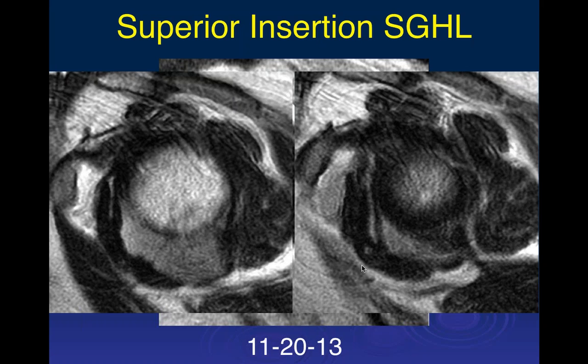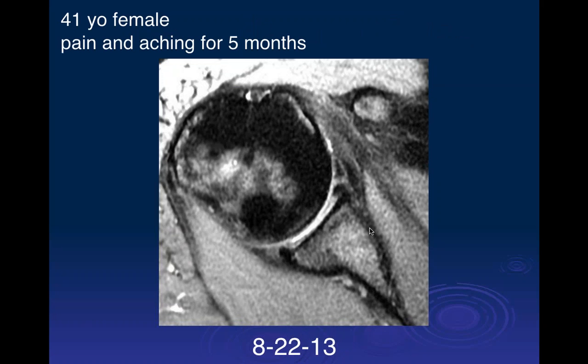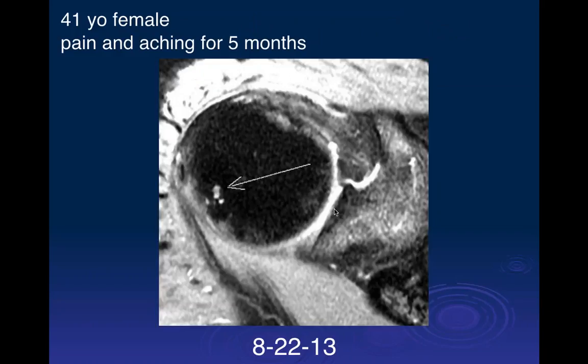If we go back to the axial images on this case, is the anterior labrum absent anteriorly and superiorly? Like if you keep going higher? Or is that too high? Okay. We skipped a bunch of steps here. This is that common area where the anterior labrum, the superior insertion of the inferior glenohumeral ligament, the middle glenohumeral ligament, and the superior glenohumeral ligament all come together. So I'd have to look at all the individual images to clarify.